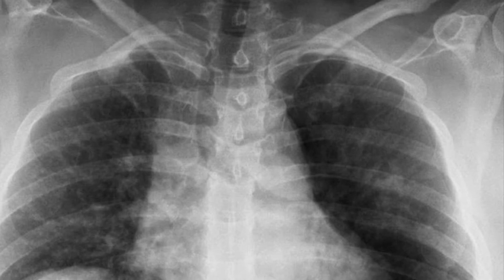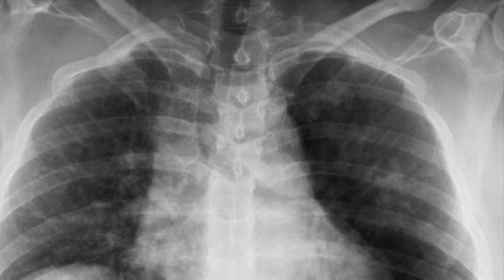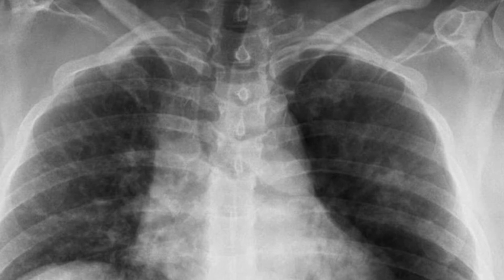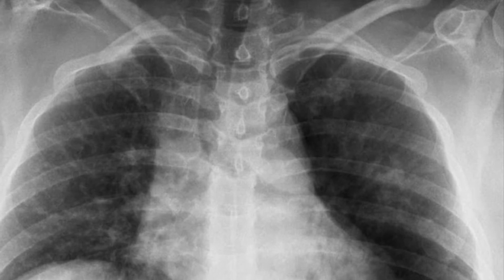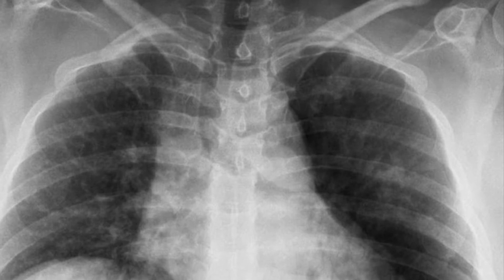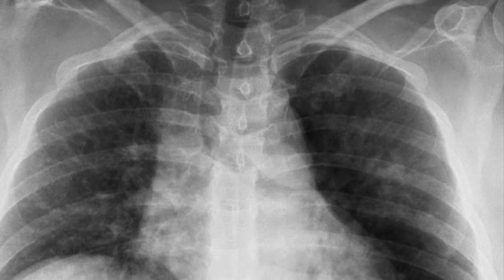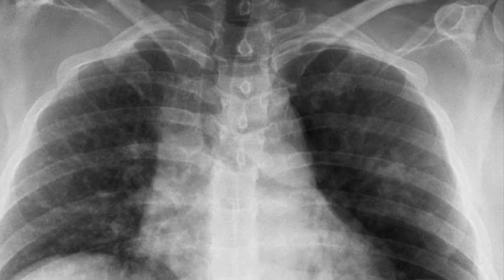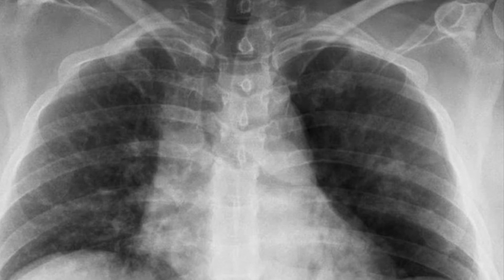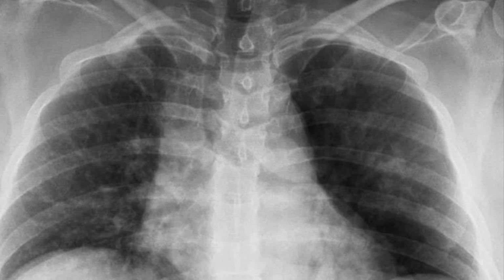The third type of pneumothorax is injury-related pneumothorax. It is injury to the chest that can cause a collapsed lung. Some people experience a collapsed lung due to a fractured rib, a hard hit to the chest, or a knife or a gunshot wound. For the chest x-ray, you will see the visible visceral pleural edge and a relatively increased transparency of the involved left hemithorax on the supine AP radiograph. This occurs as in the supine position gravity causes the lung to fall dorsally, allowing the air to collect anteromedially, laterally, and basally.